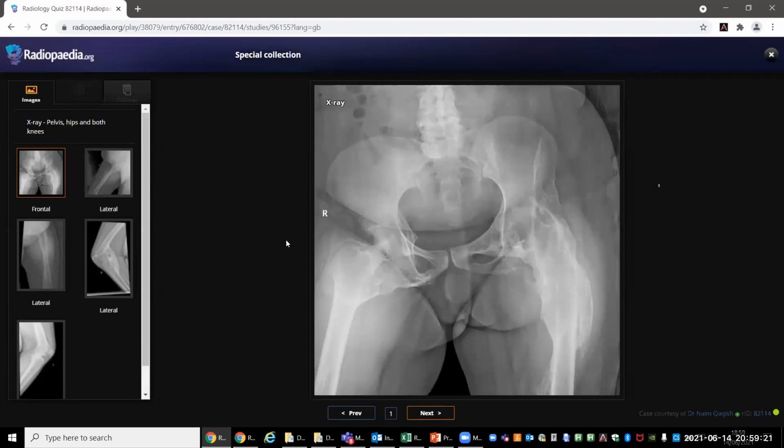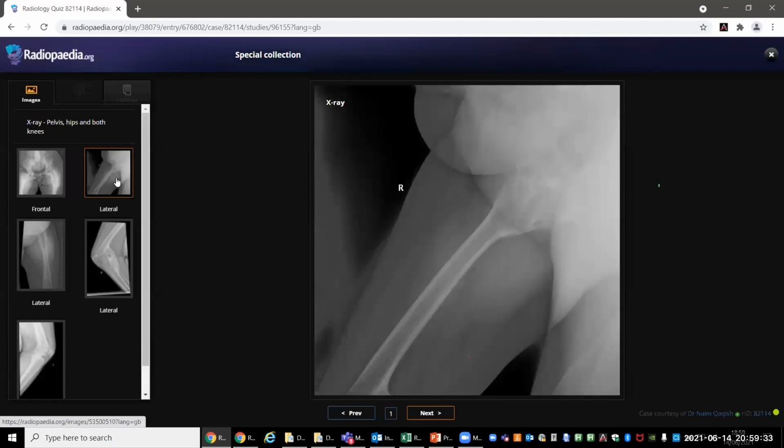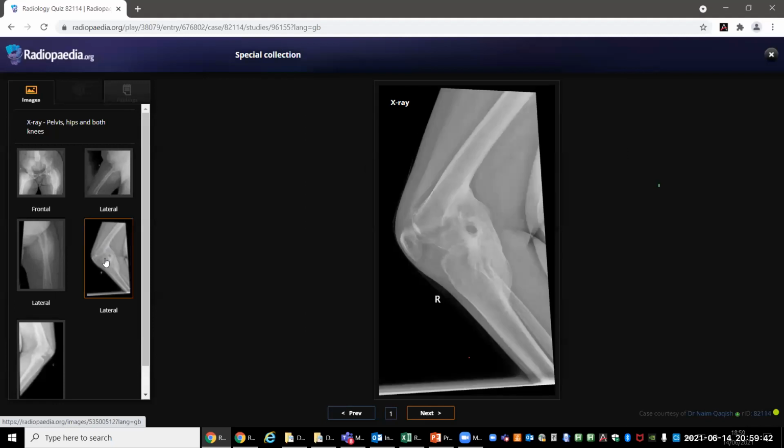I think this, yeah. Can I see the other images, the lateral view, for example, if possible? I'm not sure that would really help you, but I'll give you. I mean the one which is below it. The knee one, yeah, okay. The knee joint is also disturbed.